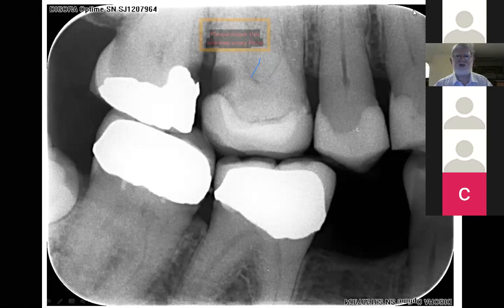What issues are we seeing, and why have they arisen? Okay, so we're looking at caries, root caries. We're looking at the 1.7 caries. We're looking at the 1.6 caries and the open contact that gave rise to all of this.